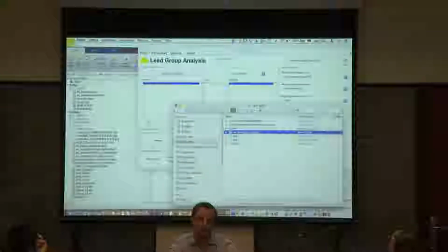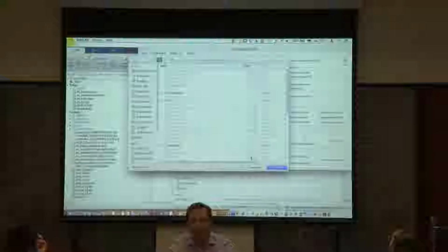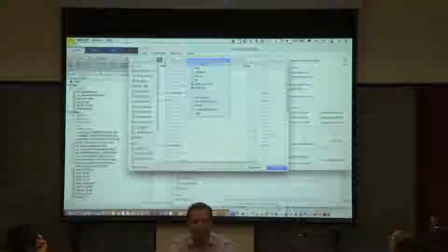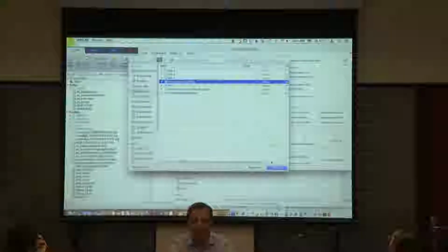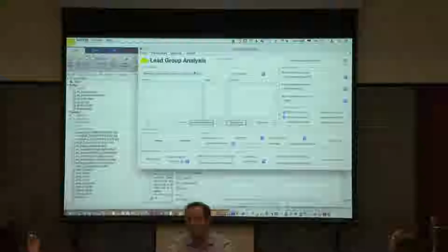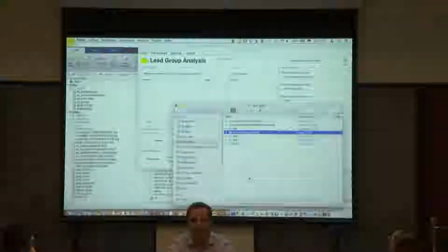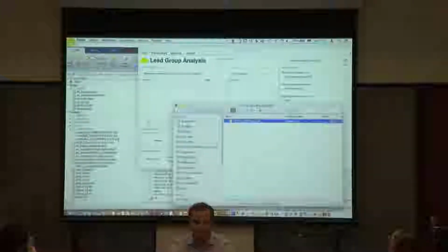So it's just a blank folder, nothing inside. You can choose this folder to store the stats in. So I will just choose this folder, and now Lead Group will be set to this folder and store everything inside here. And inside here we have one file only which stores all the information about the model.